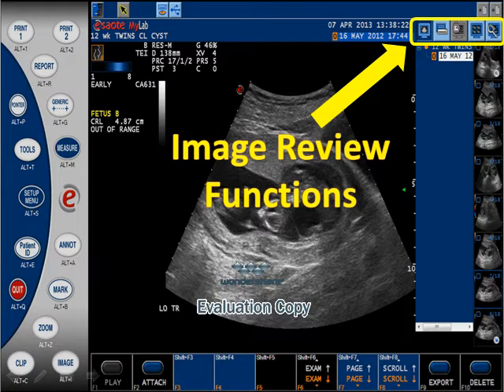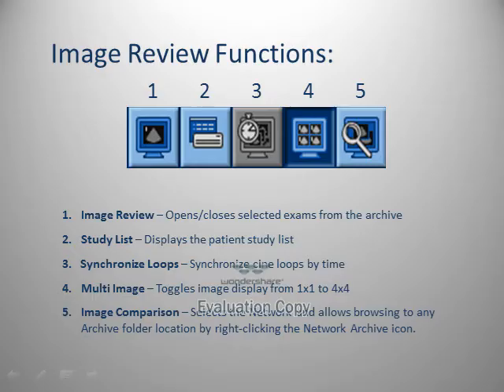Once a study has been opened, its first image will be displayed in the center of the screen. In the upper right-hand corner, the functions available in image review are displayed. Here are the image review functions.